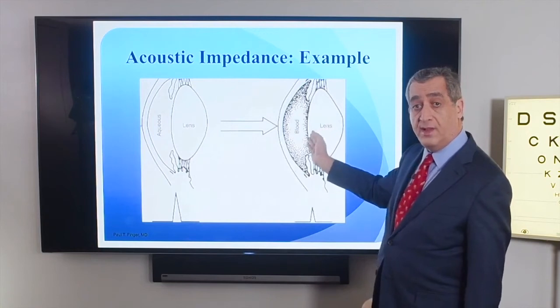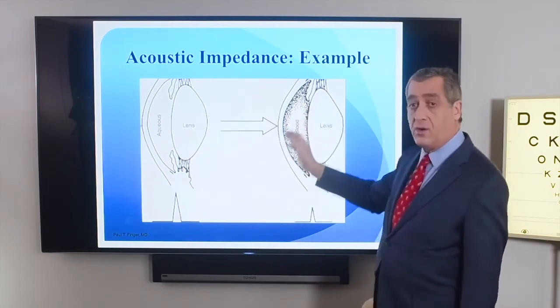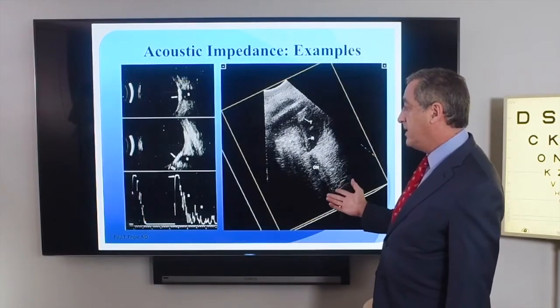Blood is more similar to lens. Therefore, there'll be less reflected sound, and this spike here would be lower. These are some clinical examples.